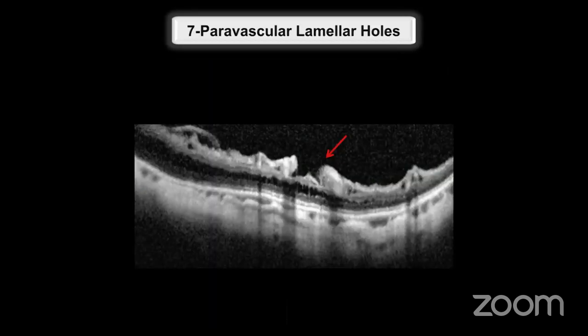Another change is simple defects around the blood vessels, which are very common, especially in high axial length or very highly myopic eyes.